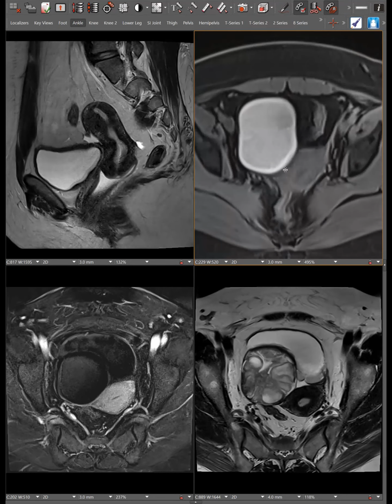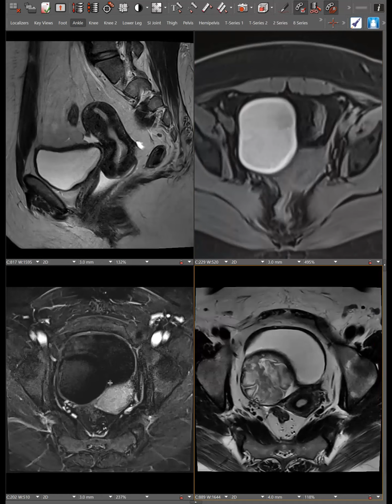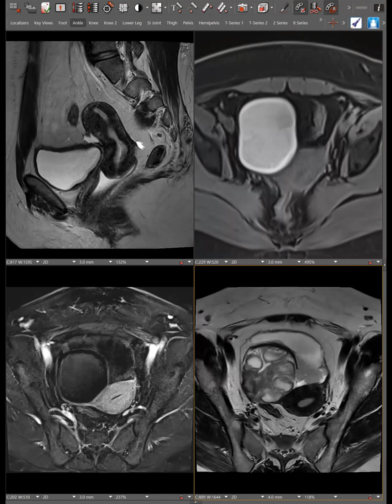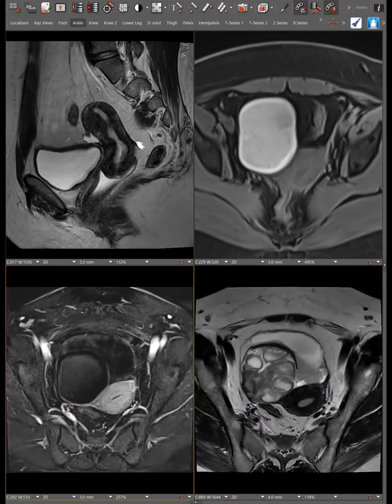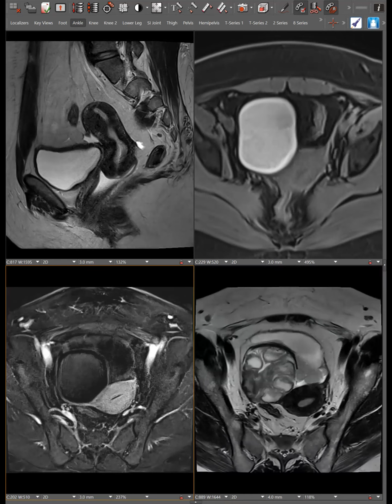And, you know, the knee-jerk response when you look at a T1 hyperintense lesion is that you think of an endometrioma. And then this is the T2 correlate here. And this is the post-contrast of the same lesion. I'm withholding some history, so feel free to ask questions about the patient's history.